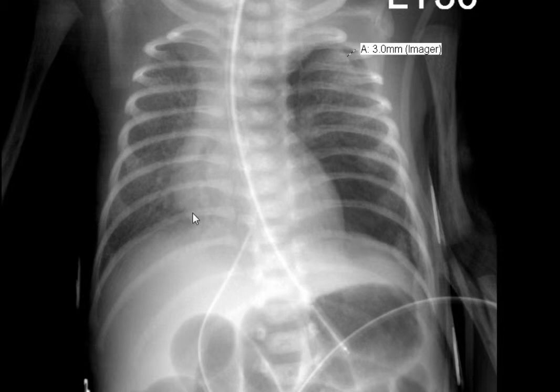As I said in my earlier talks, generally the lungs are symmetrically involved, so if the heart border is a little bit indistinct on one side, it should have the same degree of indistinctness on the contralateral side. So often air medially will make the heart border look sharper on the side where you have a medial pneumothorax.